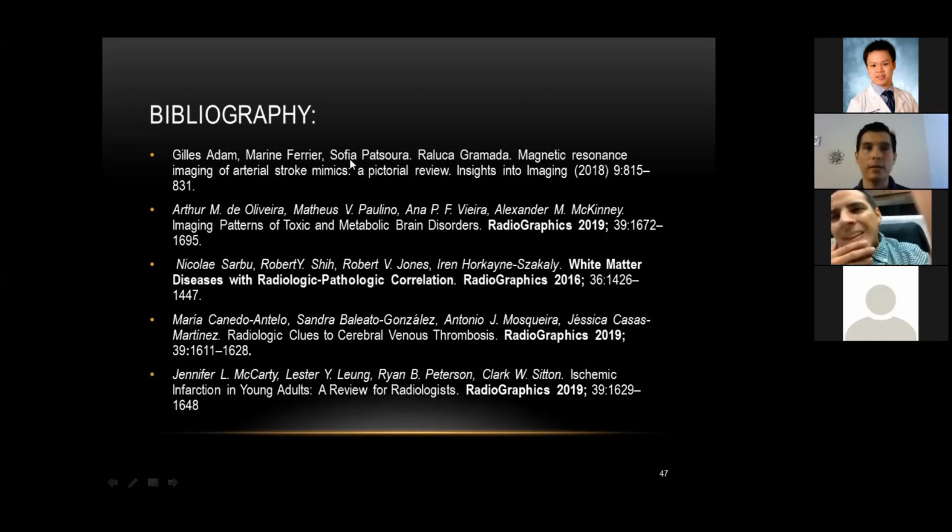This is not normally known by all the specialists, but it is very interesting, because in B0 you can see any hypointensity or hyperintensity, and that could be T2 shine through in the final imaging. The final imaging that you see is B1000, and ADC is a later process.